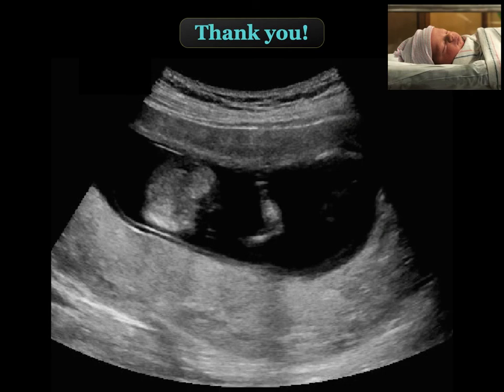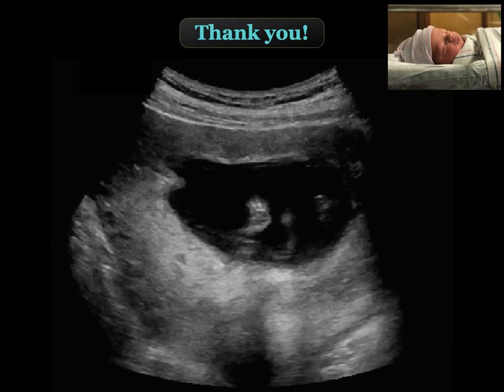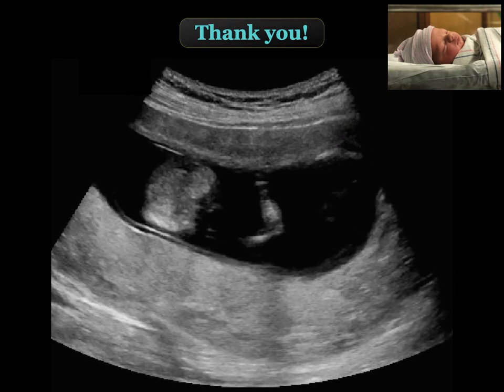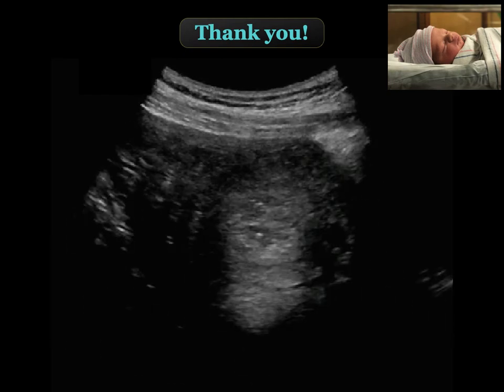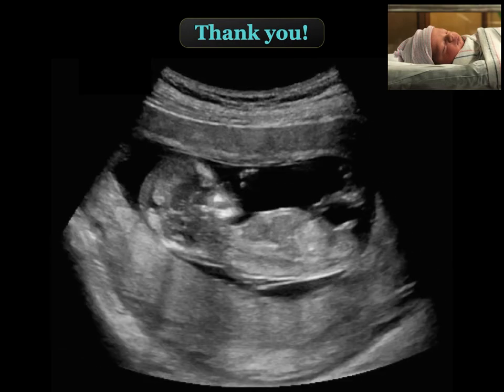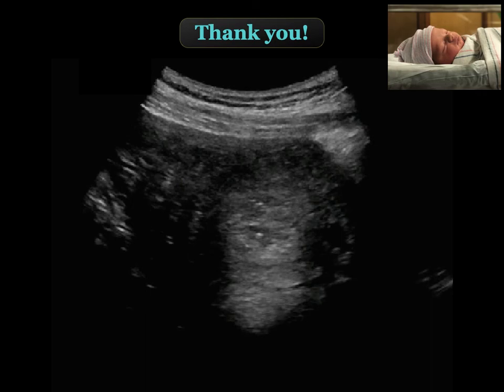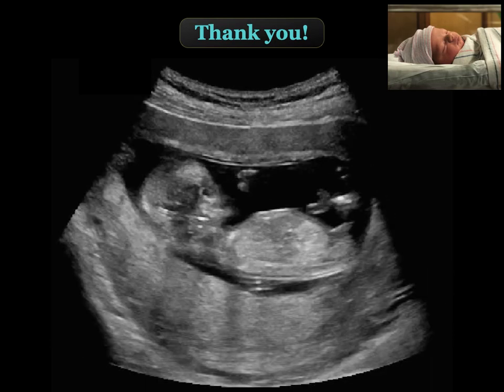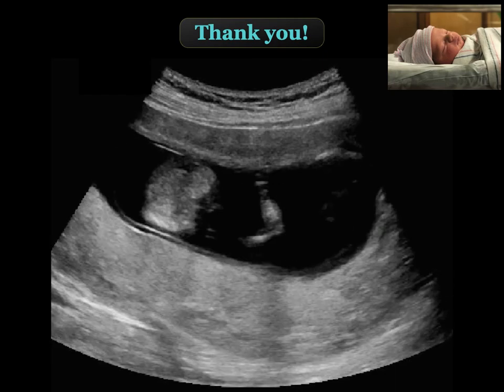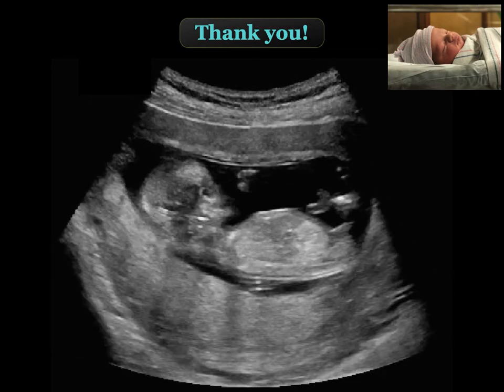So I hope that this was a useful lecture looking at the indications to perform a point of care transabdominal OB ultrasound. Remember that you're always looking to diagnose an intrauterine pregnancy, either by seeing a yolk sac or a fetal pole. Remember that you want to count the number of babies. You want to determine the fetal heart rate using M mode, or motion over time. And you can actually calculate the gestational age by measuring the crown rump length in the first trimester, or in the second or third trimester, the biparietal diameter, abdominal circumference, or my preferred option, which would be femur length.